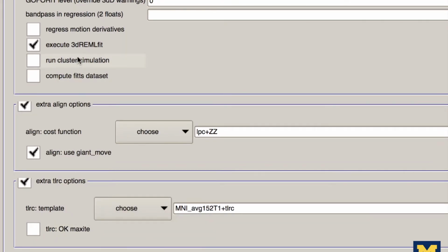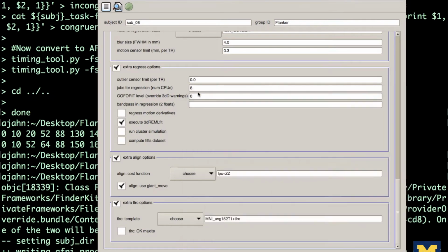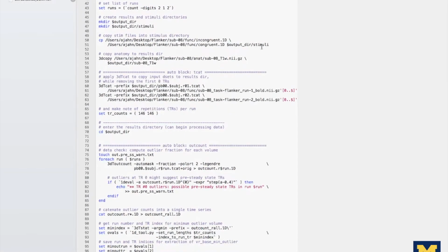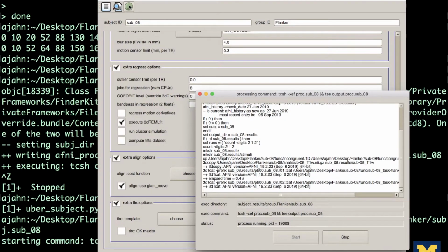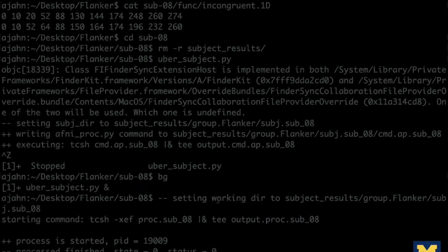Now run the script by clicking on the same three buttons that we clicked to pre-process the data. Before pressing go, don't forget to make the same changes to the script as before, such as init xform after the auto-TLRC command. In this script, the data will first be processed, and then a model will be estimated. The total processing time will be about 5 minutes.